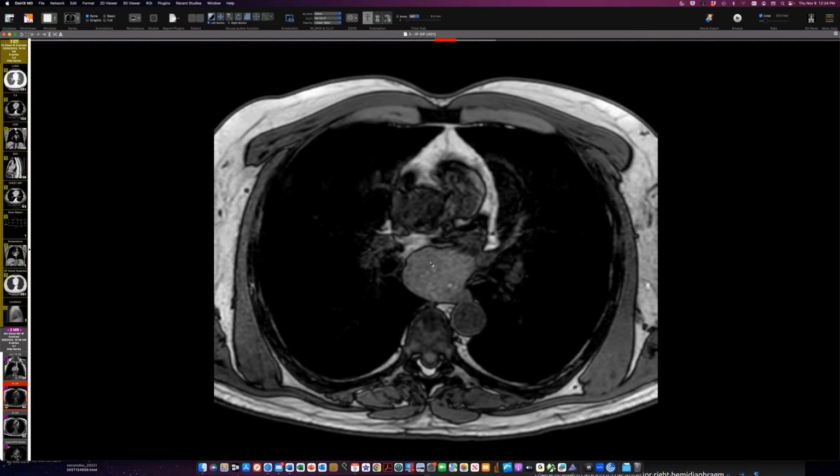Because this lesion thinks it's a bronchus, it's busy producing bronchial mucus, which is proteinaceous, and that's why it has higher attenuation than water. So pericardial cysts have low attenuation. They're called sometimes spring water cysts because it's just like water, usually less than 10 Hounsfield units. The bronchogenic cysts have a protein component, so they have slightly higher attenuation. Classic location here. So just a nice example.